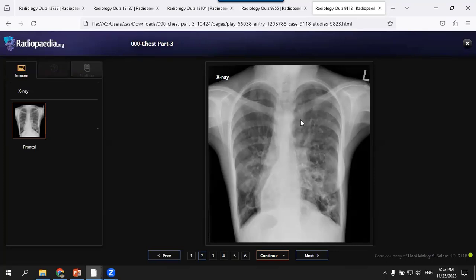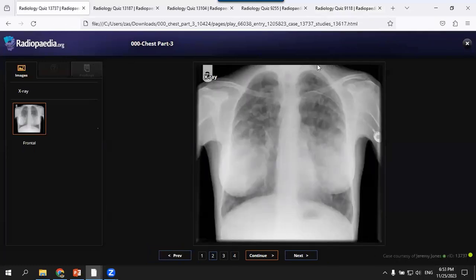This is very easy to come in the exam, but I want to list all possible scenarios of a cystic lung that mimics a bronchiectasis. If you think this cystic pattern is a bronchiectasis, look for a porta cath or central line, tunneled line, in a relatively young age.